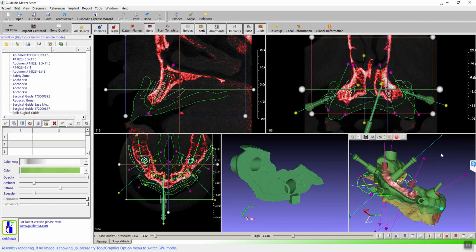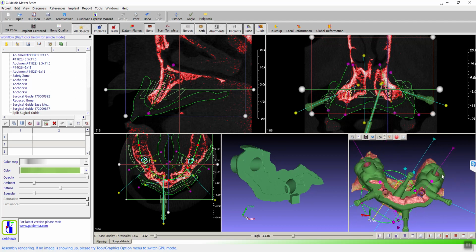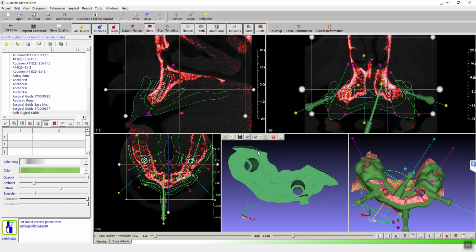Well, when we designed this on our own, I'll have Tim print the jaw. I'll have him print the maxilla and the reduction guide and the other clip. That way you can practice once before you. So it doesn't clip in, it's just resting. Yeah. The problem we're having is the word click or clip in. There's no real retention there, is there?